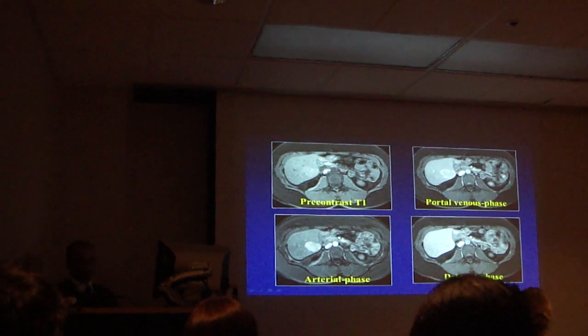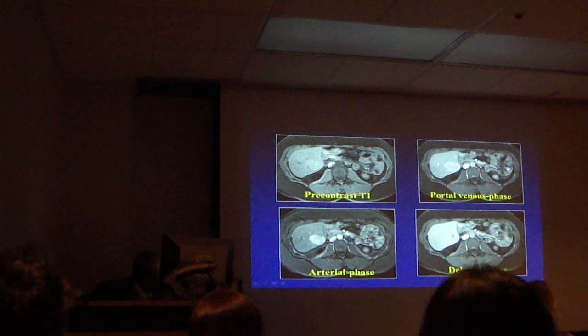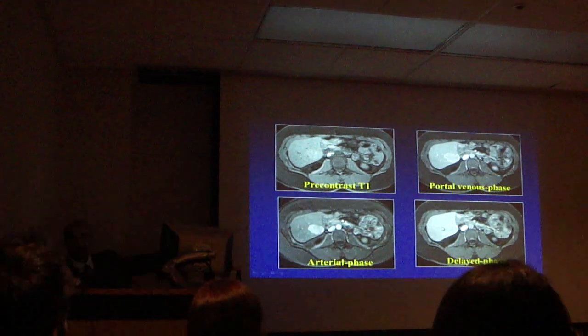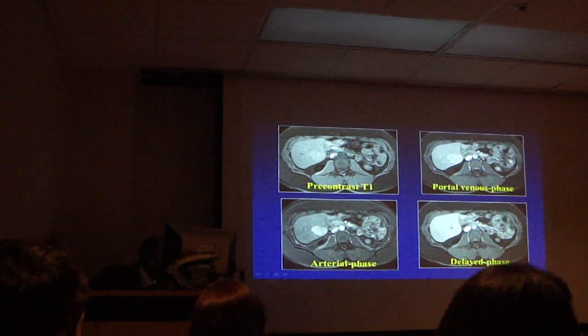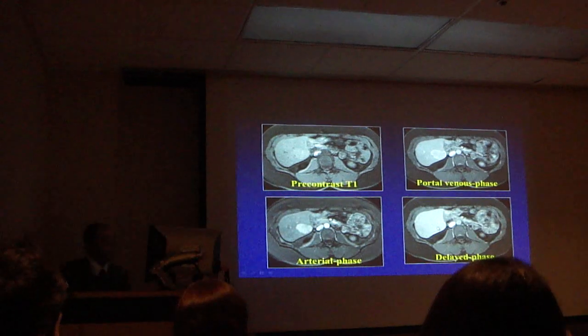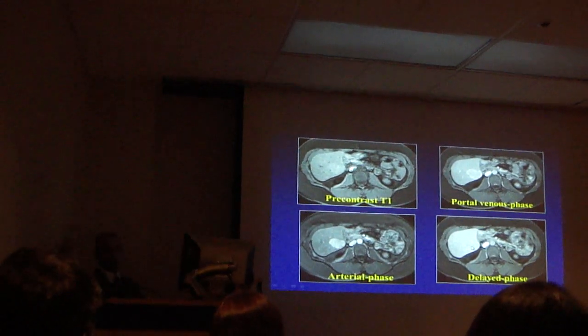It completely blends in. You can also see, is it projecting that? Yeah, it is actually. Your screen is better than mine, I tell you. It's projecting better there. But you can see that there is a thin capsule around it. Can you see that thin, fine line around it? So, what are we thinking now?